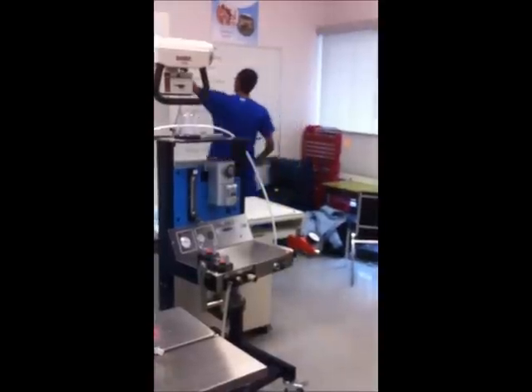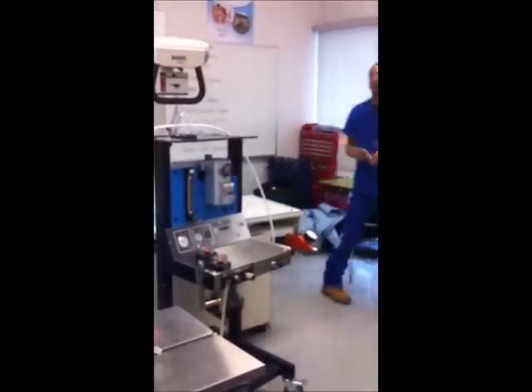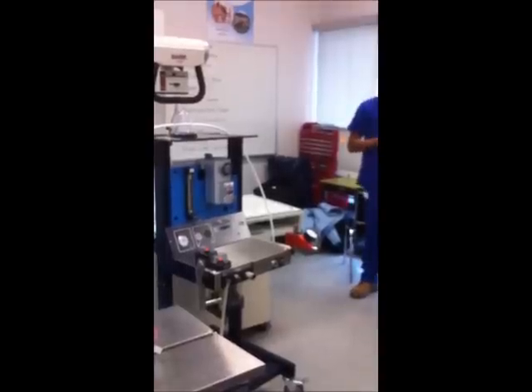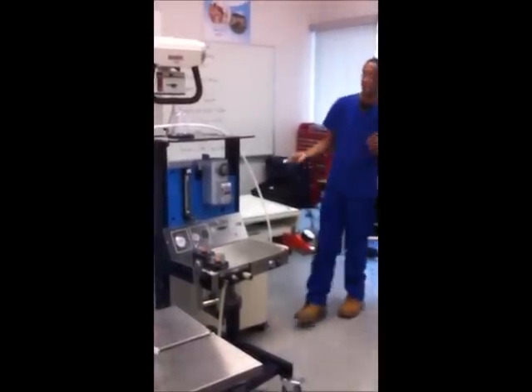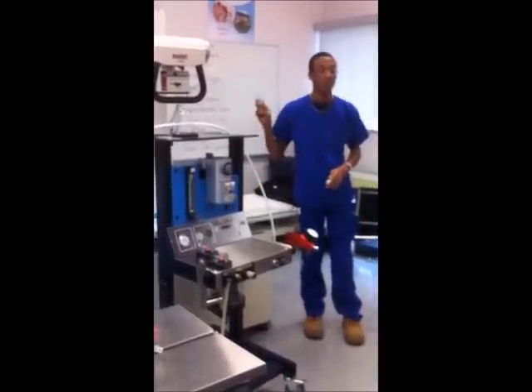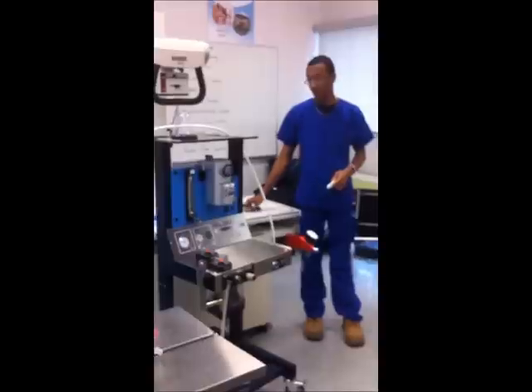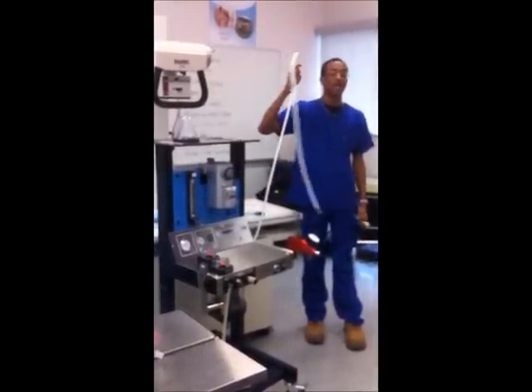With all that's on the board here, what's the first stop? Where does it start? Oxygen. And oxygen is represented by what in the anesthetic machine? The hose. Not that one? The white cord. The white cord. So this is where it all starts.